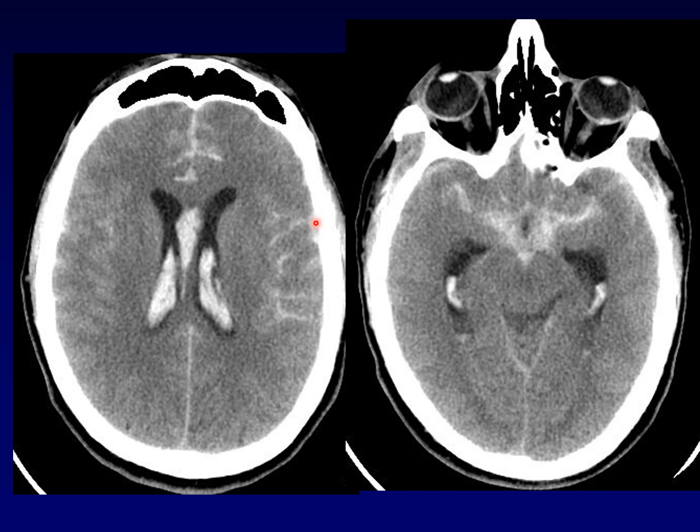When you see these finger-like projections of hemorrhage extending down from the surface deep along the sulci, you know you're in the subarachnoid space. After all, the subarachnoid space is where the CSF normally lives. And so when the CSF is replaced by hemorrhage, it has the same configuration as the CSF would have had. Notice also that the basal cisterns are completely filled with blood, and this star configuration of the basal cisterns is characteristic of a subarachnoid hemorrhage.